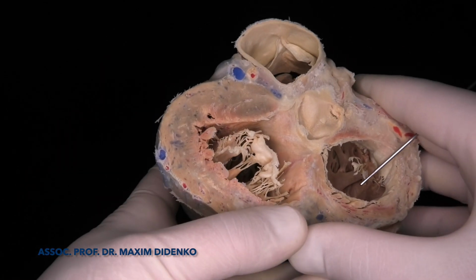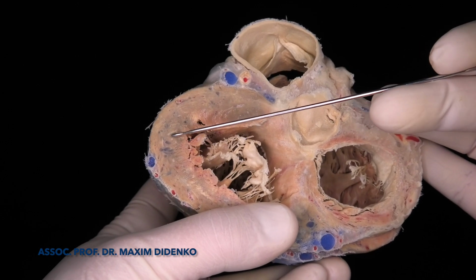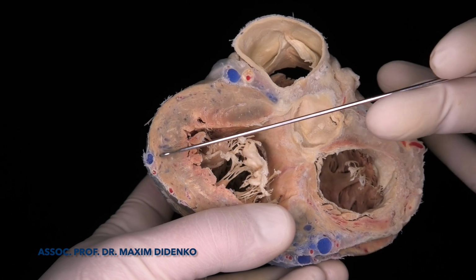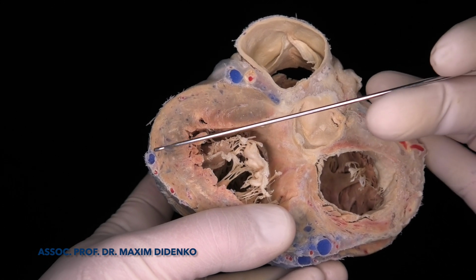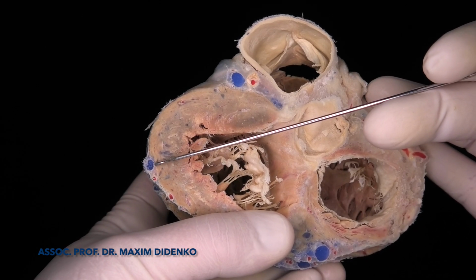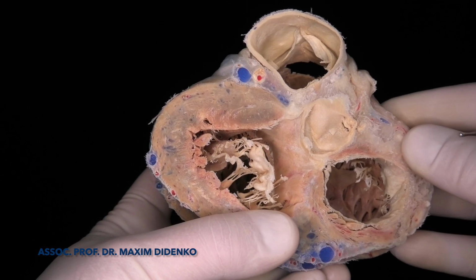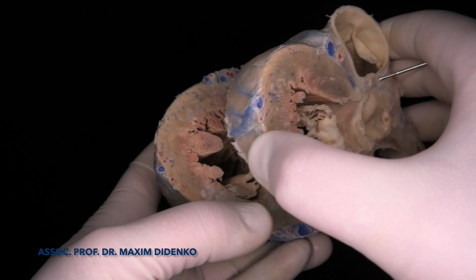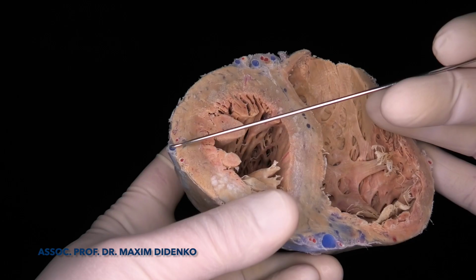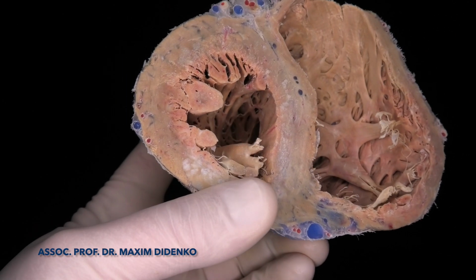We can also imagine this vein located just on the lateral side of the scar area. Imagine a scar is located here, then it can create even more difficulties in pacing and delay in activation of this part of the ventricle. So again, we can see it in different cuts. This is a lateral vein here and its relation with the left ventricle.